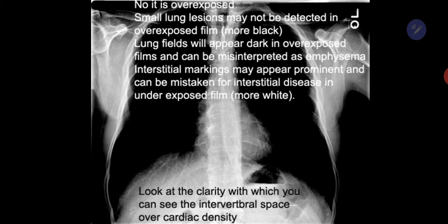If you look at this image, this is not appropriate exposure and this is overexposed, and you can see the intervertebral space through the heart.